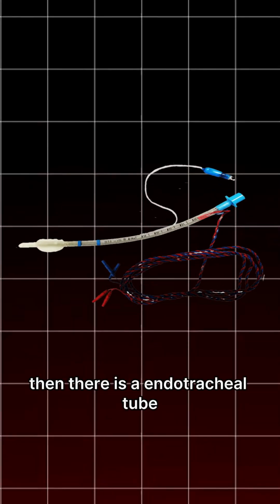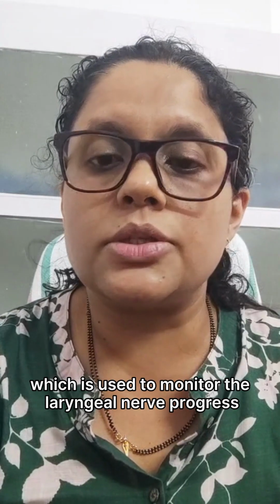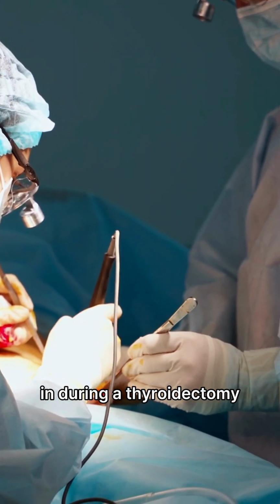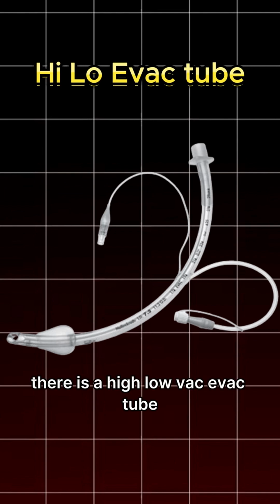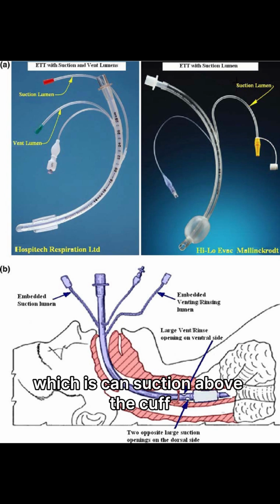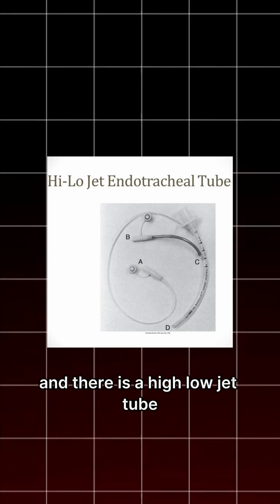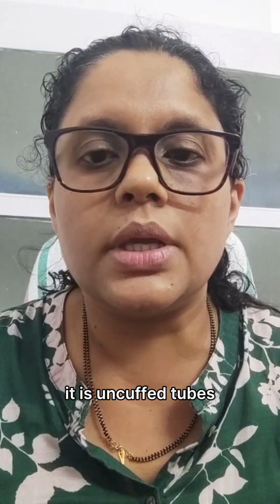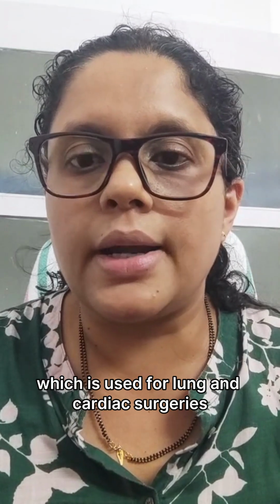Then there is an endotracheal tube which has electromyogram electrodes, which is used to monitor the recurrent laryngeal nerve during thyroid surgery. There are laser resistant tubes. There are Hi-Lo Evac tubes, which have specialized suction channels, which can suction above the cuff and even below the vocal cords. And there is a Hi-Lo jet tube, which is used for jet ventilation. It is an uncuffed tube. And finally, you have the double lumen tubes used for lung and cardiac surgeries.